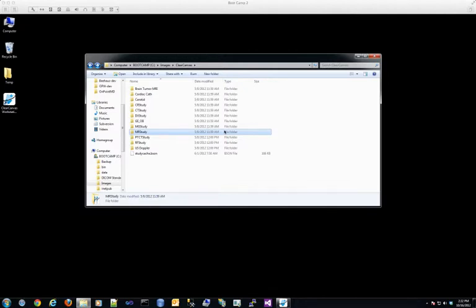Hello, this is part 3 of a 4-part video series on how to use the OnPoint DICOM Study Analyzer tool. This section will focus on sending DICOM data.